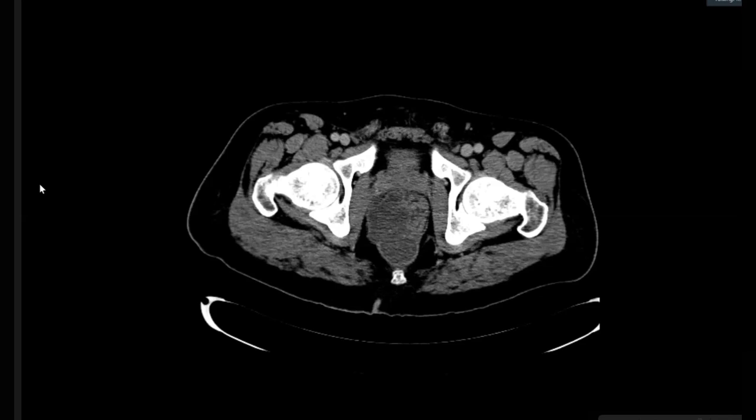Sir, likely an abscess. What's against abscess? An abscess is an inflammatory product after an infection, sir. No, what's against abscess imaging wise? Sir, a localized collection. So an abscess can be localized? Yes, sir. So what's against? Sir, to sum it up, for me it's a benign looking pathology, to be precise. So you will inform the referring physician.